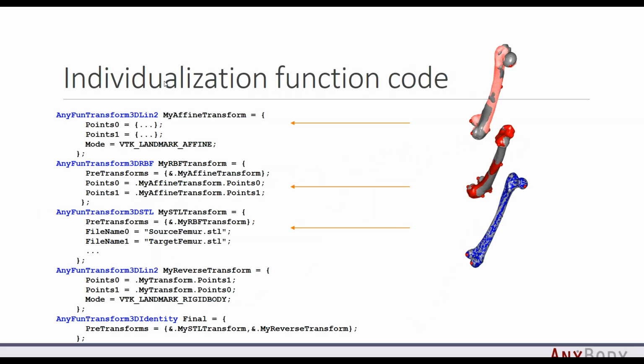I was talking a lot about the pipeline of transformations, and this is how it looks. It's a little bit simplified, but it still looks quite scary. What I want to say is that you actually don't need to worry about that, because this is a piece of code that remains constant all the time for almost all bones. So what you would need to do is just copy this block of code somewhere and then adjust it to your needs a little bit.